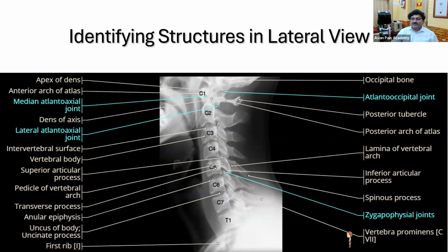It's the foramen. Okay. Because in the cervical spine, as I have told, the vertebral bodies are smaller and the articular pillars are larger. And here the intervertebral foraminal openings are not directed laterally, which is a difference from the lumbar or thoracic area. It is directed slightly anteriorly and inferiorly. So in an exact lateral view, we are not able to see the foramina. So that's the difference. Okay.